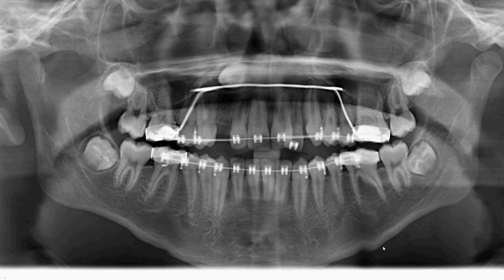So in this case, we're probably looking at a patient's motion-related artifact. So motion artifact: the patient moved as the source of the X-ray was going around to image this site. Obviously the cause of the motion is unknown, whether the equipment may have hit the patient's shoulder or the patient may simply have moved. So I don't know, but this is an example of patient movement.